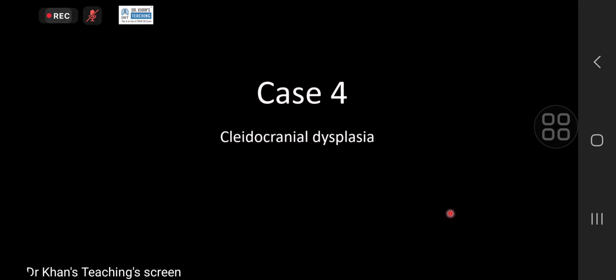So you did well, but a bit of confusion was there, which I'll clarify when we go through the case. You did initially well, but there were a few things on which you got a bit confused, should I say. So it is cleidocranial dysplasia. This is what it is.